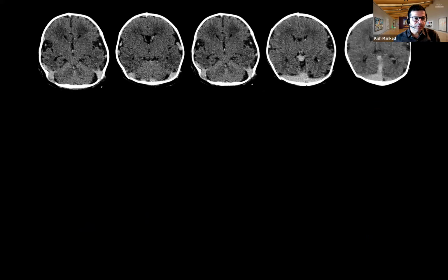Compare that with this situation where you have large, dilated dural venous sinuses, internal cerebral veins, even your cortical veins that you see are quite chunky. So, what do you think might be going on here?